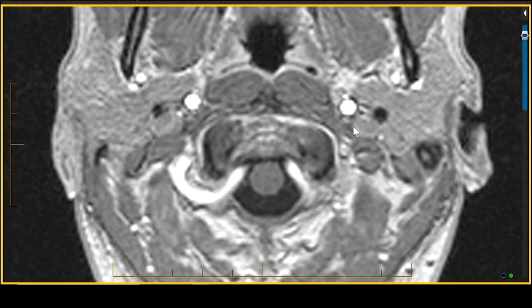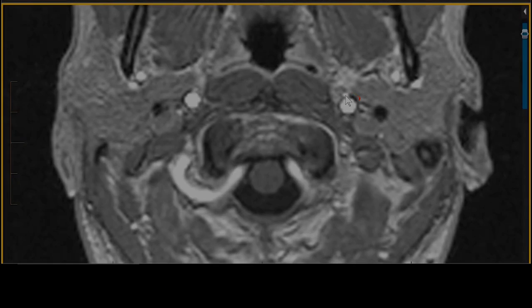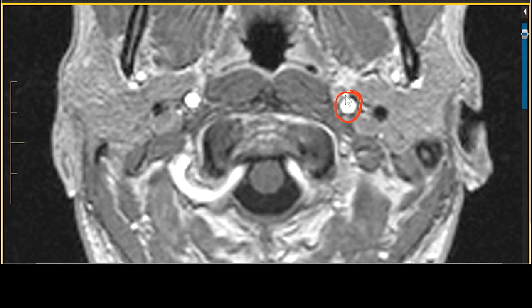For the right and left vagus nerves descend from the cranial vault through the jugular foramen, and they penetrate the carotid sheath between the internal and external carotid arteries, and then they pass posterolateral. We're not at the level of the common carotid artery, but if this were the common carotid artery, the perforation is kind of in a posterolateral orientation to the common carotid artery into the carotid sheath.